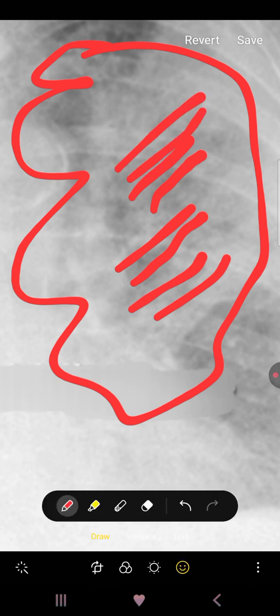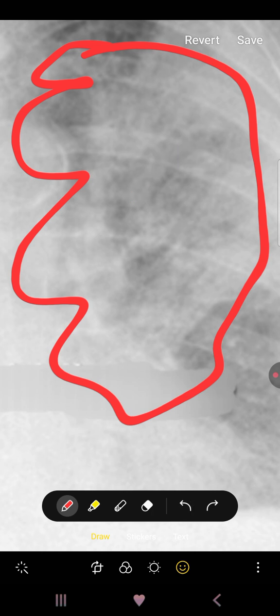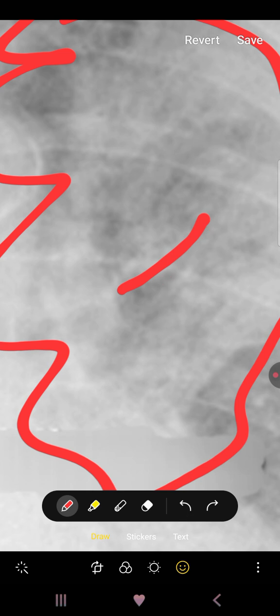You can appreciate some tubular structures that have not turned white. I've removed the red lines, so focus on them more clearly. See a tubular structure not turned white. These are the air bronchograms. These are actually your larger bronchi that have not been involved by the consolidation. So air bronchograms are mostly present in X-rays that show consolidation.